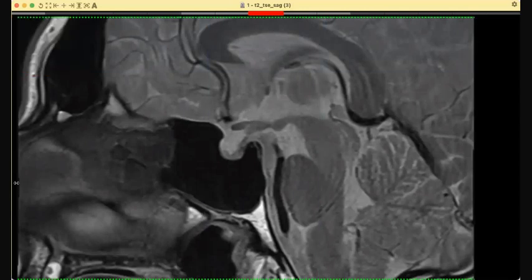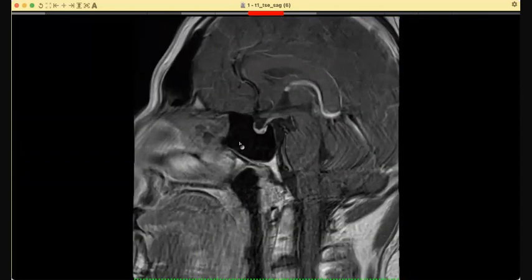Next candidate is last candidate of the day. Candidate 6, are you with us? Yes, I'm there. Okay, so this is a case of 24-year-old patient presented with polyuria. They have said hypothalamic dysfunction, question mark, polyuria. They have asked for MR of the pituitary. Over to you.